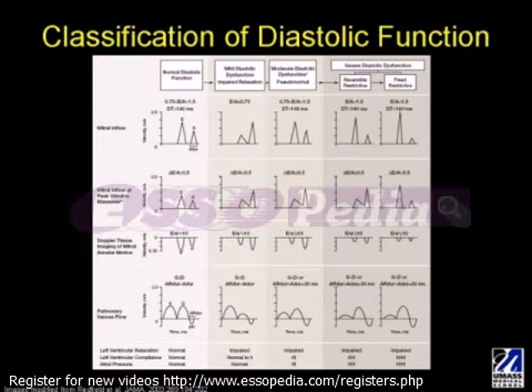Now we have more severe diastolic dysfunction, which is stage 3, or reversible restrictive filling, meaning the Valsalva reduces the mitral E wave by decreasing preload. This filling pattern indicates elevated LA pressure and LV end diastolic pressure. Also, you see that the pressures equalize rapidly between the atrium and the ventricle. Therefore, the deceleration time is very fast.